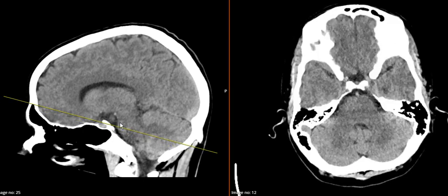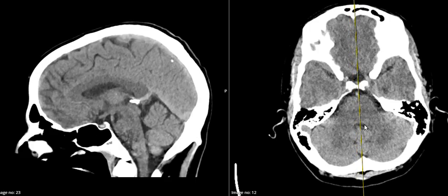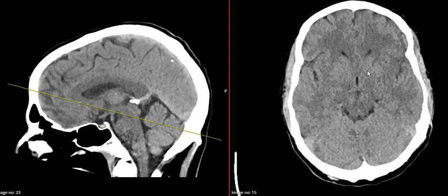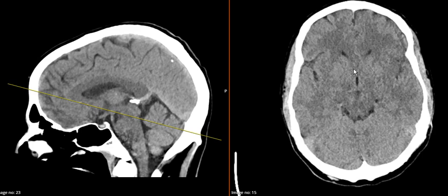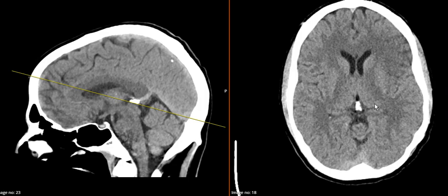And the cerebellum, just make that back there, nice and midline. And as we roll through, we've got pons, cerebellum, and coming up into the brain. So just looking for any obvious changes that might indicate bleeding, which would be white pixels, blood being more dense. You would see white where there shouldn't be, and ischemic changes might not have had any changes yet.